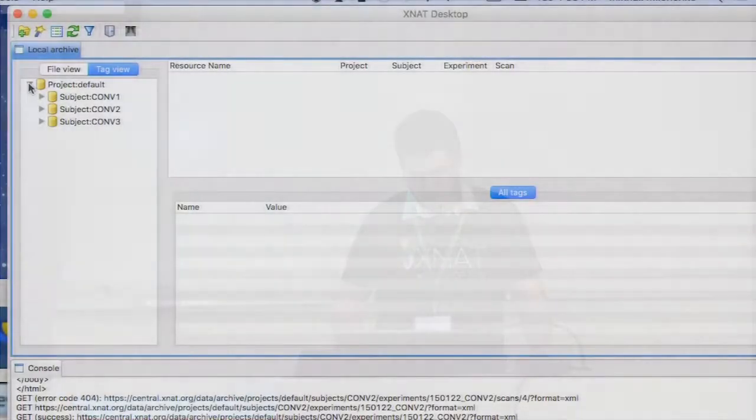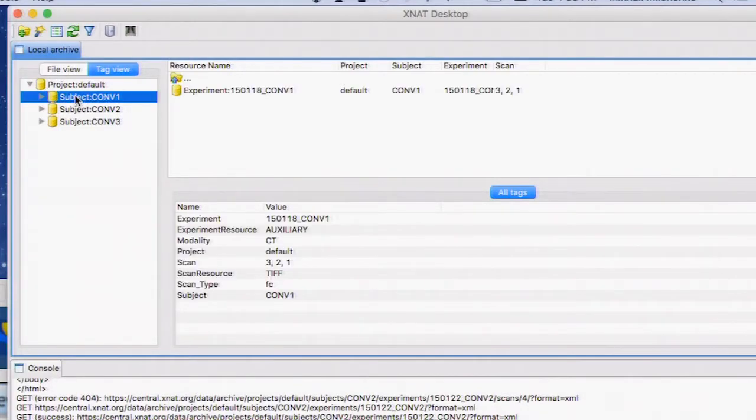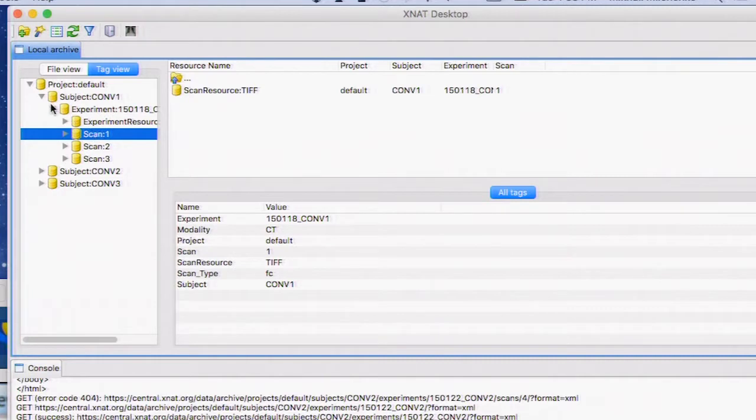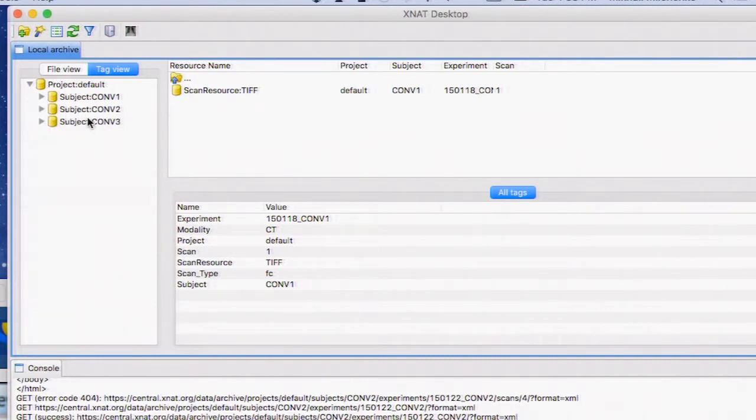And Misha, as I recall, if you have files that aren't being indexed because for whatever reason they're named wrong or whatever, there's a way to view ones that haven't been properly tagged yet, and you can find those. I didn't program it on purpose, so you definitely review all the tags that have been assigned here in the hierarchical view.